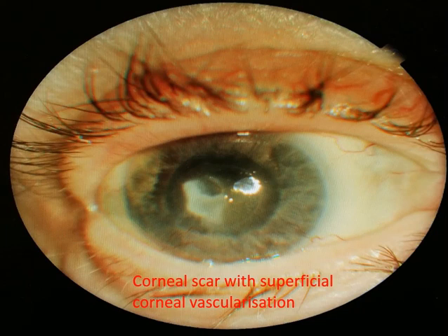This third image shows a white opacity in the center of the cornea. You can see the conjunctiva looks white, so there is no inflammation of the conjunctiva or the sclera. If you can see closely, you can see some fine blood vessels here, which is called vascularization, and there is an opacity. So basically this means there is a corneal scar which has led to some opacification as well as vascularization.